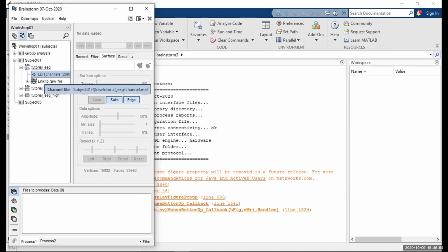So it's very important that you add, for example, if you have your own custom individual anatomy for this subject, which we do in this case, it's important that you add also your own EEG position points. So for example, a lot of people, I think, use Polhemus in order to acquire different locations of each sensor.